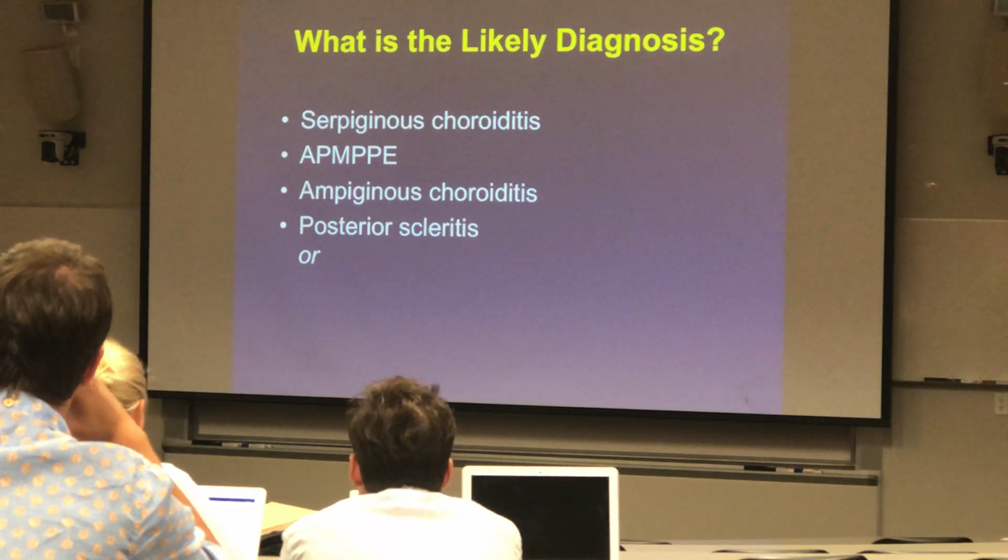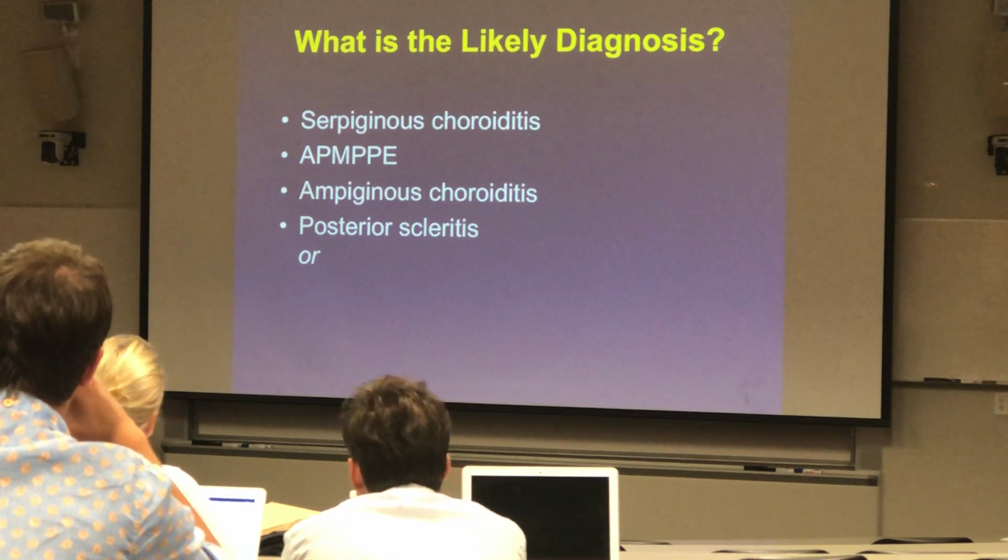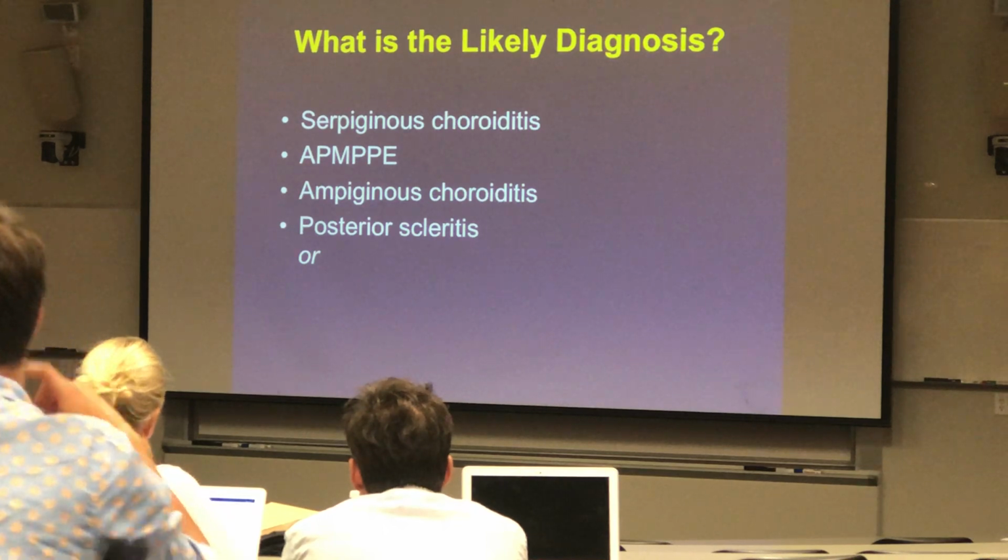That's posterior scleritis. Dr. Wong has shown you some of this. This will be a long-term chronic form of this. So far, I've mentioned four different entities that involve the back of the eye.